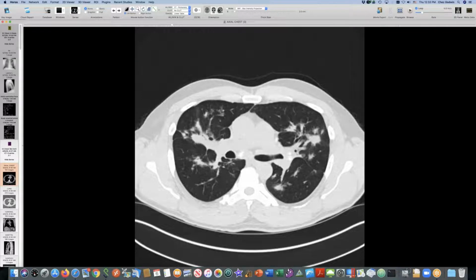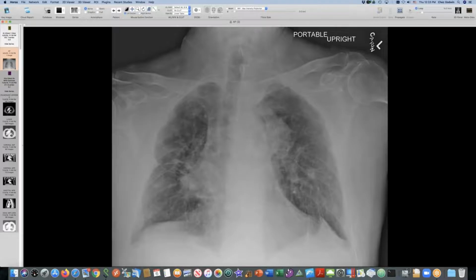So, Martine didn't talk about the high attenuation lesions. Now here's a current case that I saw just this week of these big central masses here and around the hilum here. This fellow is not feeling very well. Lots of distortion, again traction, a juxtaphrenic peak down here. This is the inferior accessory fissure, not the inferior pulmonary ligament.